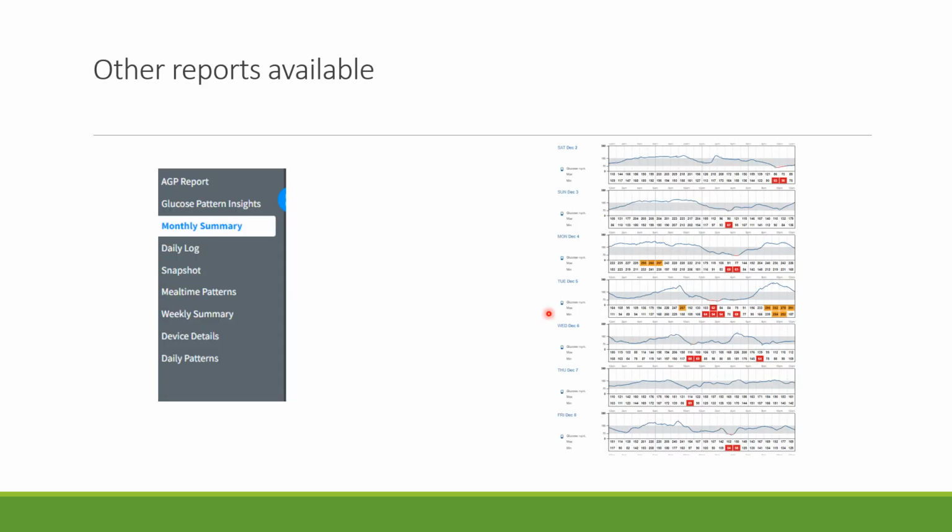Other reports that are available once you get into the accounts, here's a whole list on the Libre system. There's lots of different reports that you can go into. The one that I use all the time is the daily report.